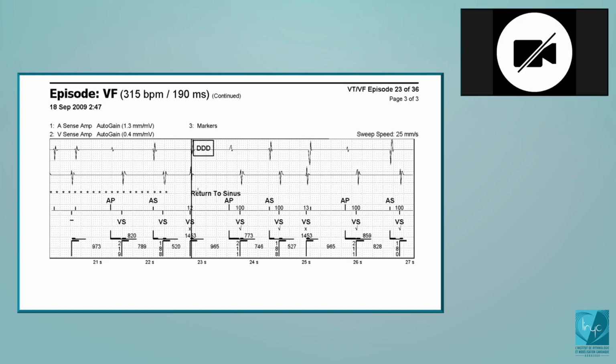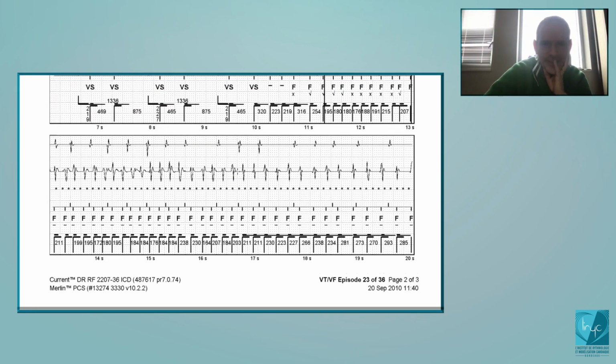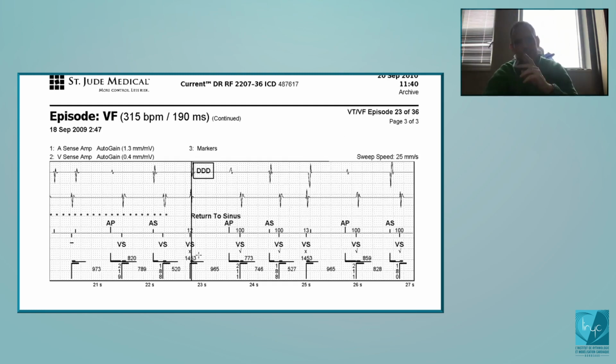And what is this here? We have a return to sinus because the counter of sinus return is on 3, you see? There is a counter for the return to sinus. All the time during a tachycardia, there is a competition between the tachycardia counters and the counter of return to sinus. I will explain to you how the counters work on the next tracing, but this is probably the most important parameter to program in an Abbott ICD.